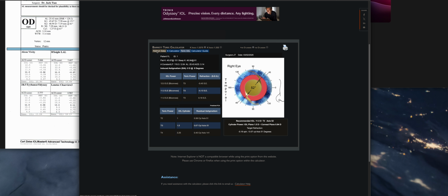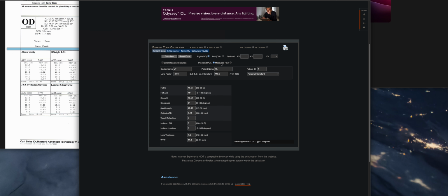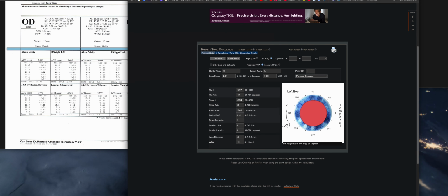And let's go back and do the left eye. Okay. Click the left eye. Perfect.